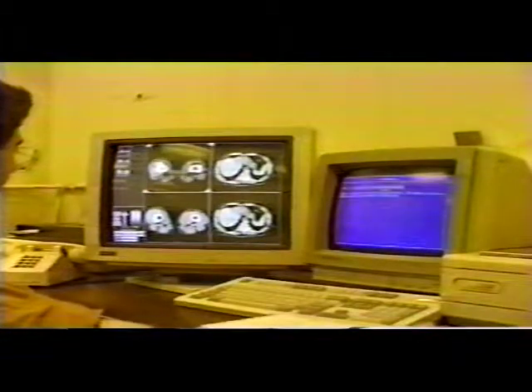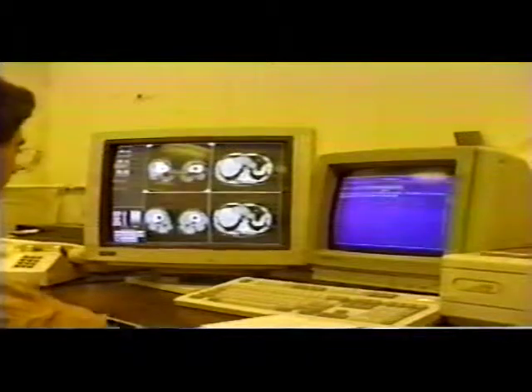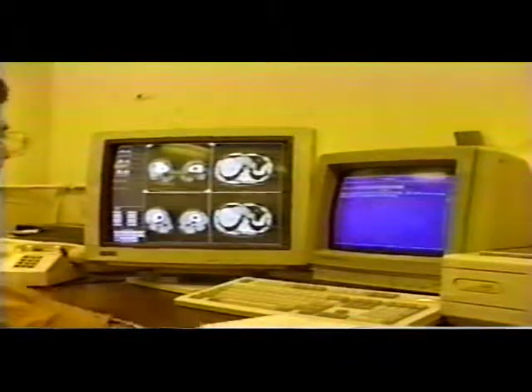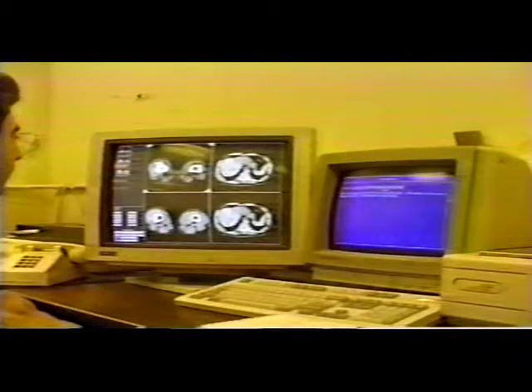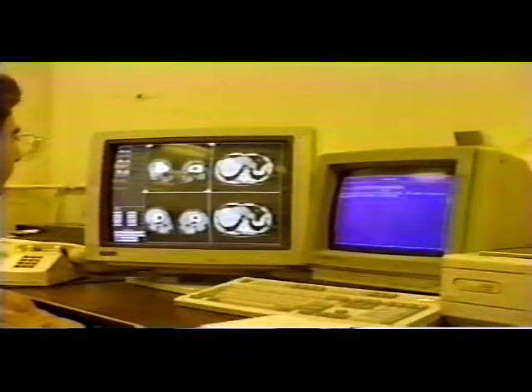Now, remember there was the other control of interest, this is for drawing new circles and so forth. And I can place a circle here, and I might want to place a square here.